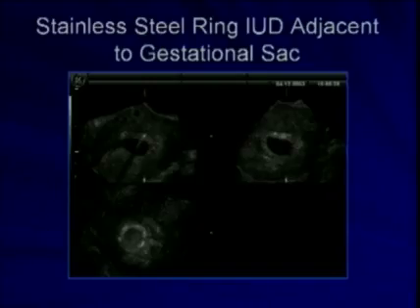And this is a multiplanar image of the stainless steel IUD. This IUD is not as effective as the IUDs that are most commonly used in the United States. Here we see the ring in the coronal plane.